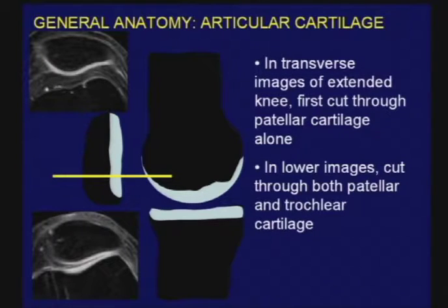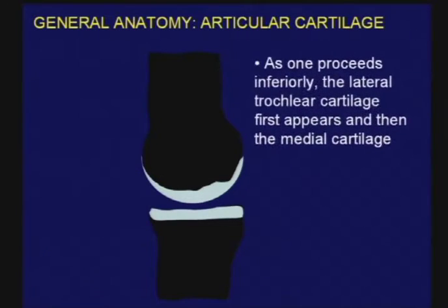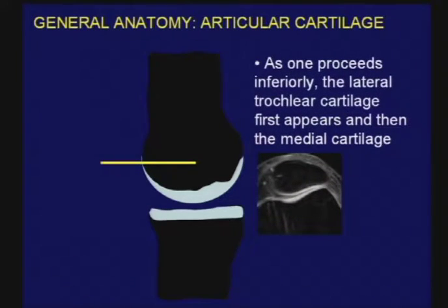Furthermore, as you know, the shapes of the patella vary incredibly, and sometimes there is a very prominent inferior pole. What that means is a lot of the lower portion of the patella contains no cartilage. You don't want to overread that absence of cartilage as a pathologic finding, because it is a developmental finding. Let's look at this in one other way that I think is interesting. We'll take away the patella and we'll look at the trochlear cartilage.